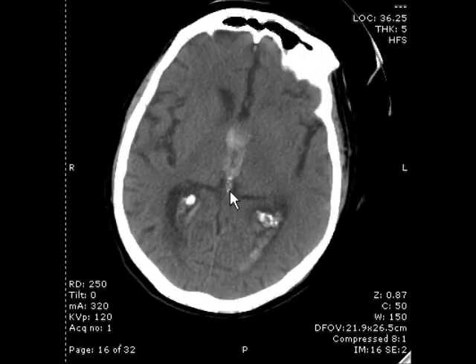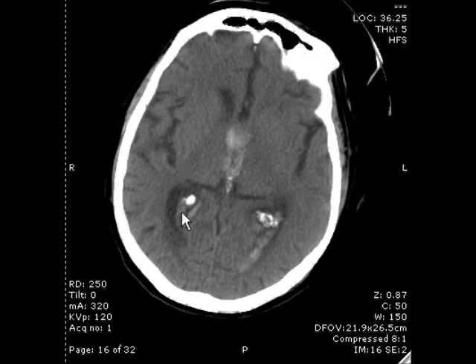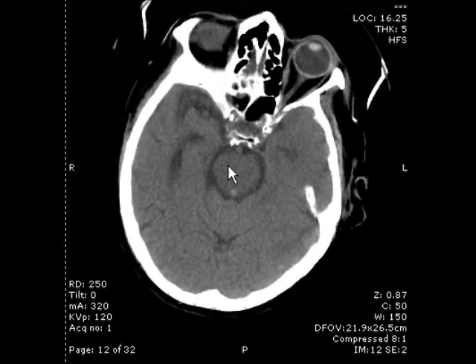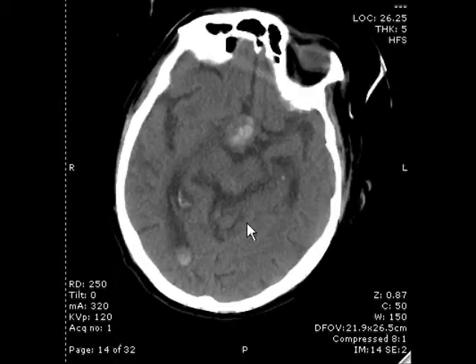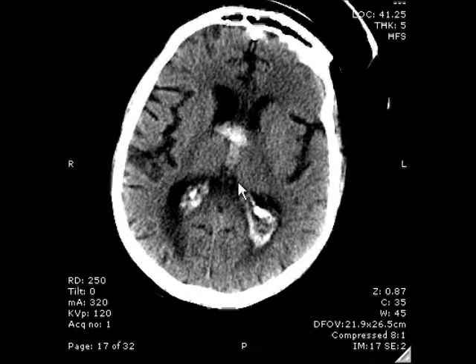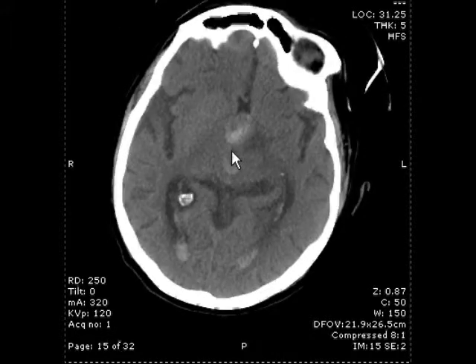And you can see that there is some hemorrhage in this brain, and we'll discuss that as we talk about the ventricle. Okay, the next portion in our mnemonic is the C for blood can, and that represents the cisterns. So the basilar cisterns are located in this area here.